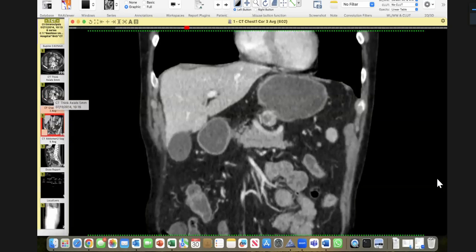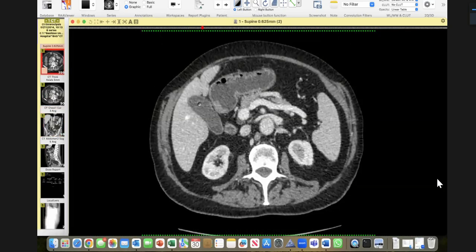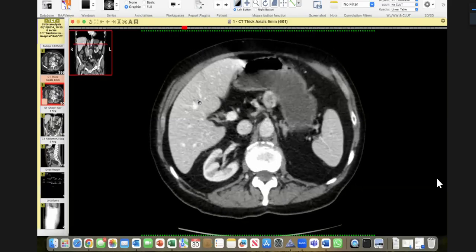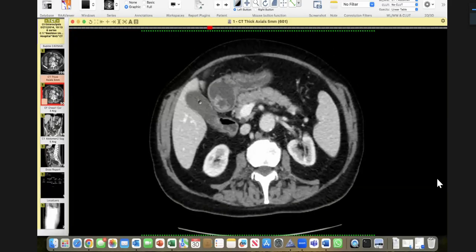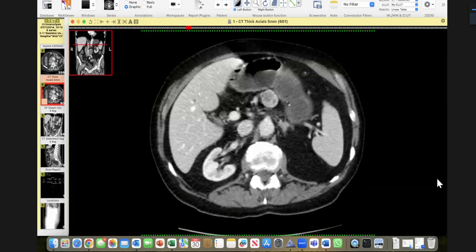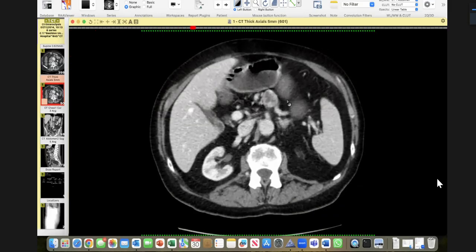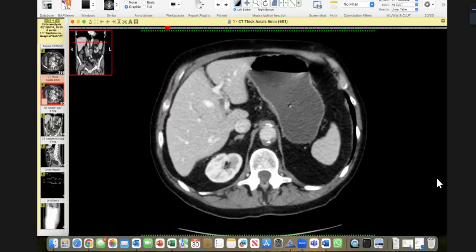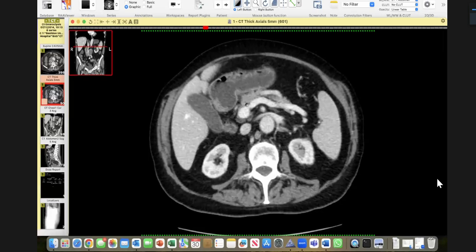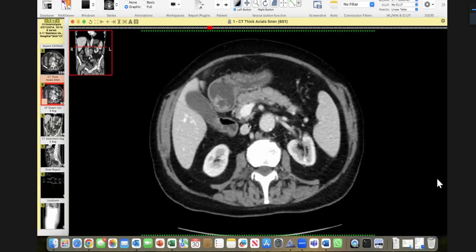Now, this is your second case, which is an extrapancreatic neuroendocrine tumor of the pancreas. Now, this is the pancreas. Around the pancreas, if you see something, this is a neuroendocrine tumor. Please remember that they can be extrapancreatic, they can be multiple. There is a concept of the gastrinoma triangle, which is in this region where I am pointing out. This region is where you will see in your exam.